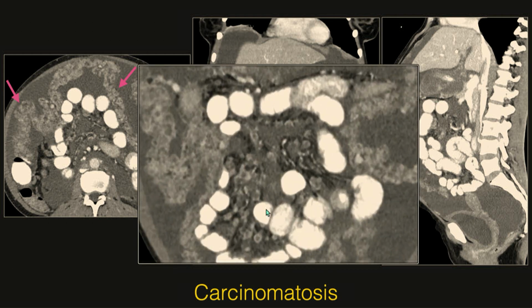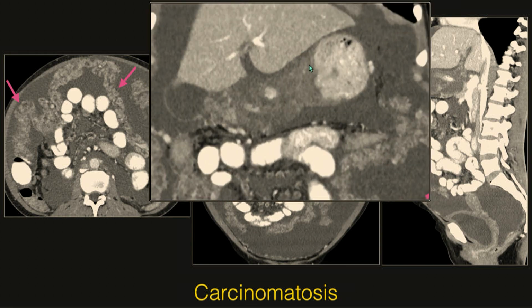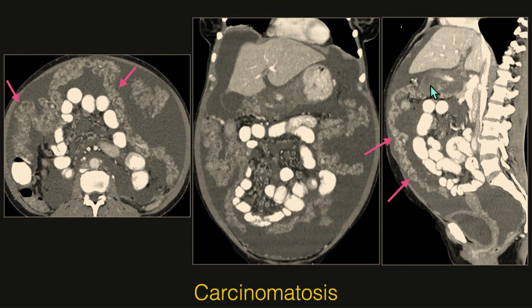And then these abnormal mesenteric lymph nodes. And then here we have that primary tumor, which is a mixed density tumor, right? So that ulceration and tumor, which I only really partially show here.